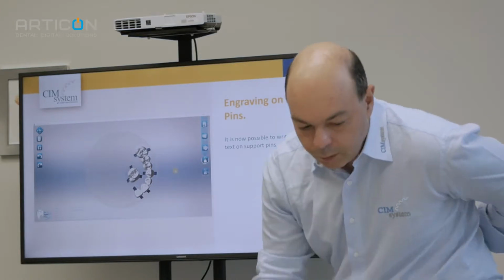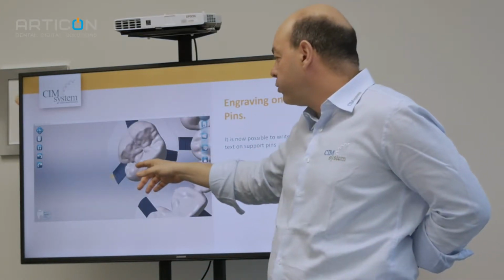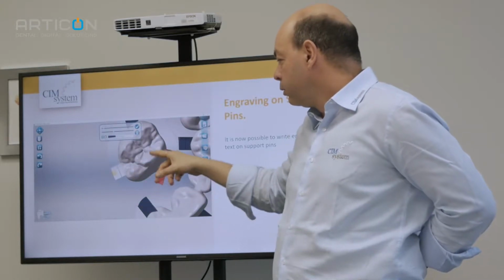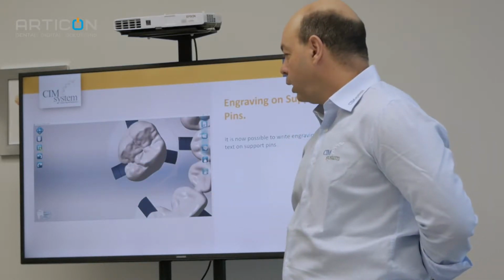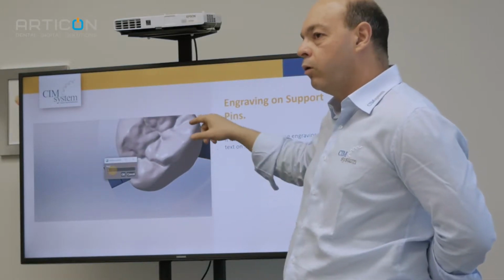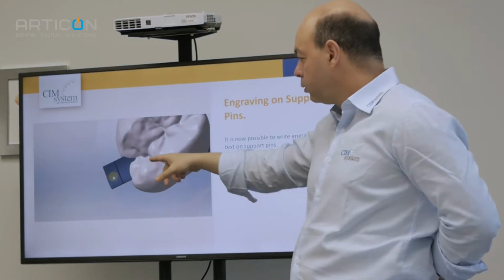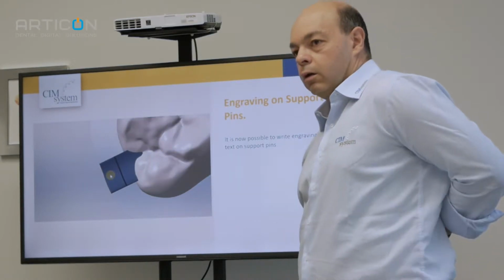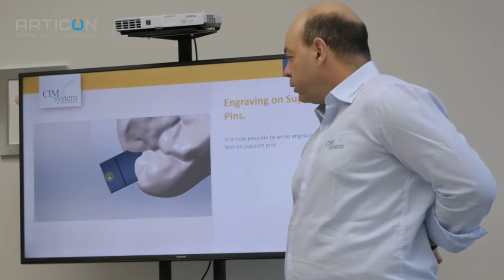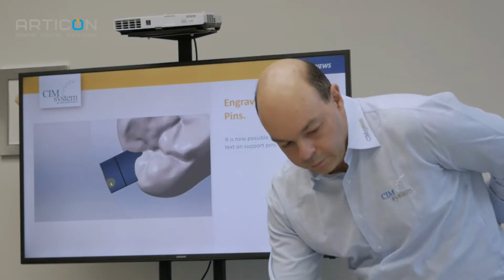This is the engraving. Now it's possible to put the engraving inside the pin. Before, if you needed to engrave, you put it in an anatomic part or in the cavity. Now it's possible to put it inside the pin. This is only for engraving.